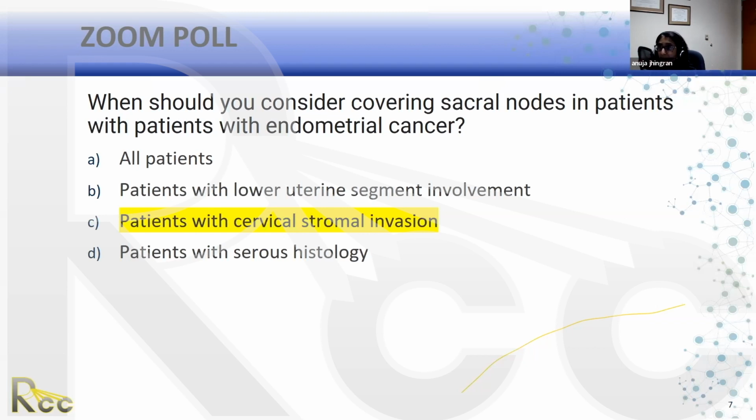But if there's any cervix involvement, or if it's post-op cervix, you do need to cover the sacral nodes at least to S2, if not S3. So that's actually a very important thing.